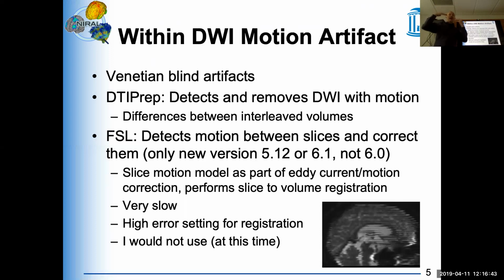It particularly depends on the anatomy. At certain locations of the anatomy, you have better accuracy of the registration than in other locations. And so I generally would say you should stay away from this until we have good results that show that this is consistent and indeed valid. I would not use it. And also, it's super, super slow. In general, this new version of FSL is going to be slow, but this probably doubles the computation time, if not more.